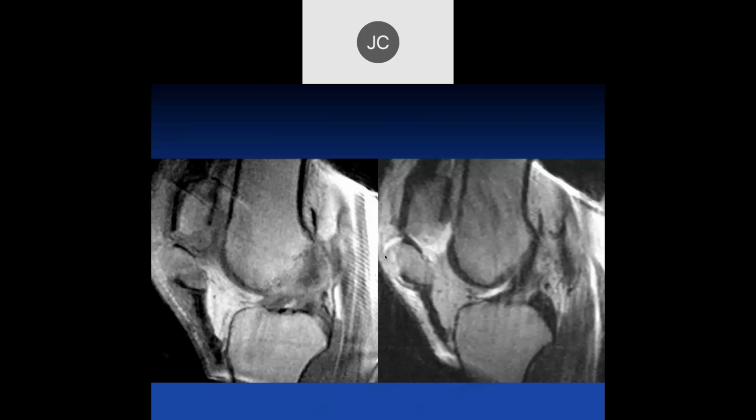All right, looks like we have a transverse fracture through the patellar body with distraction of the fragment. So here's a transverse fracture, and the distal pole is significantly angulated so that the cortical margins are no longer lined up, as we can see in this patient, and this is a patellar fracture.